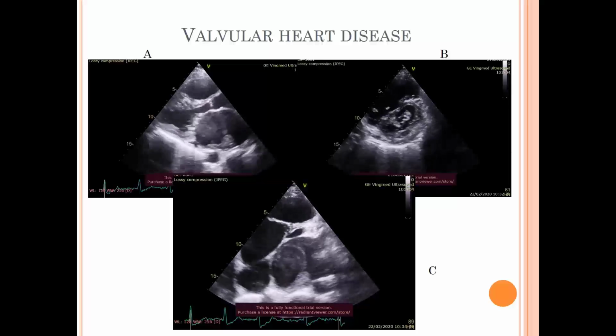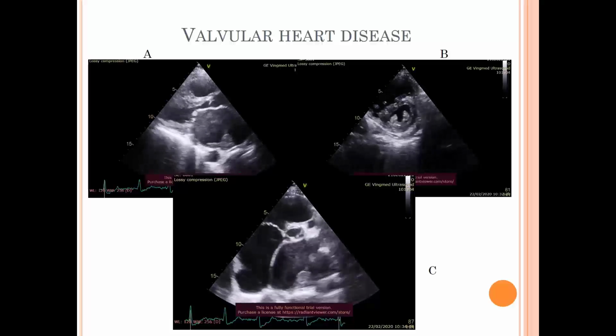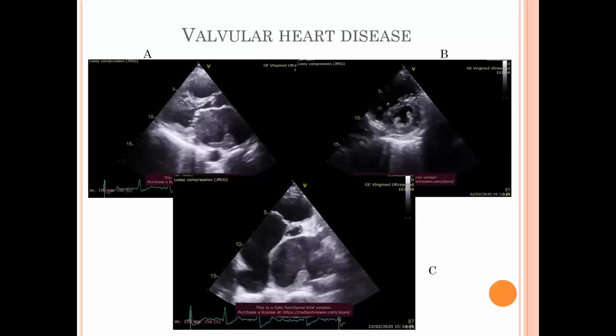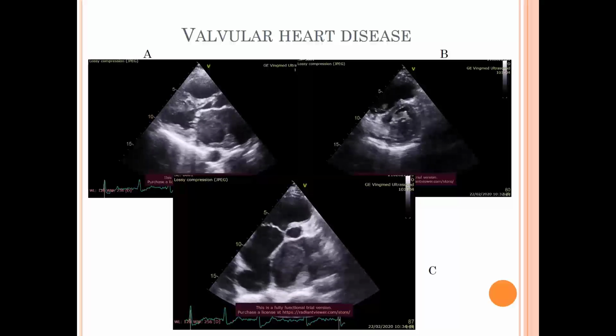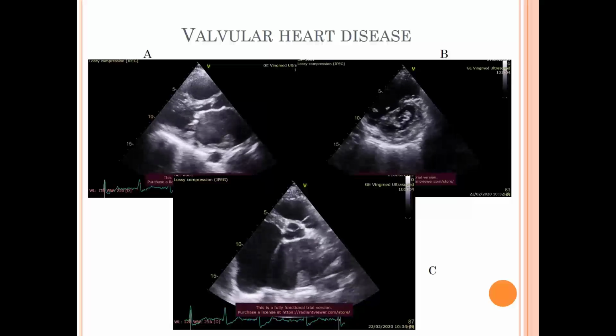What we are concerned with again is that there is an organized thrombus in the lateral wall of the left atrium. This patient, unfortunately, was insisting on refusing surgery. That's why we were following her up. This is not the usual scenario for treatment.